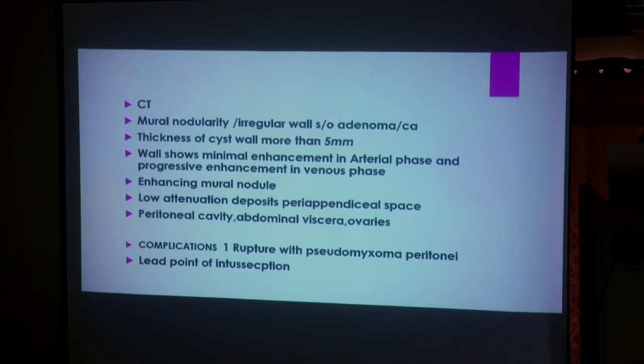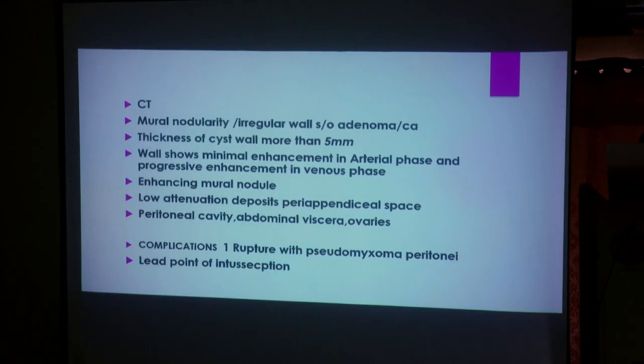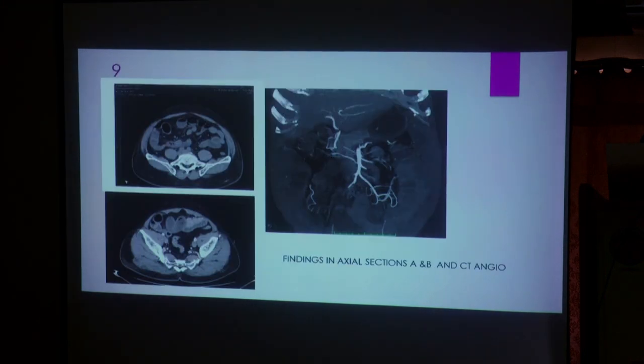Then another important part while imaging a mucocele is the associated pseudomyxoma peritonei. Either in the pericecal region, in the entire peritoneal spaces, or adjacent organs, you will be seeing deposits. And another complication, it can even be a lead point in intussusception.